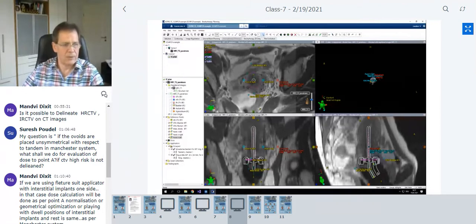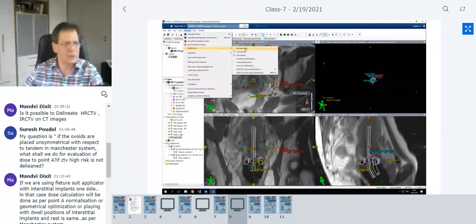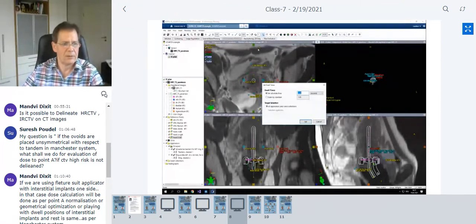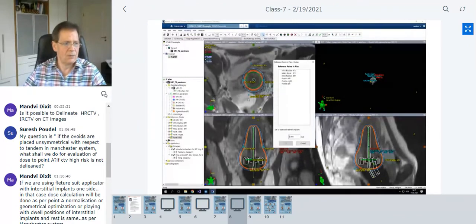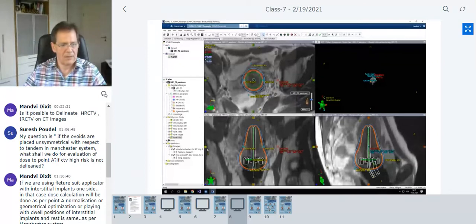We just need some dose. So we need some time in the 12 times or in the 12 positions. So there's one possibility, the simplest possibility: I set the 12 times manually. For example, I could start with a time of, I don't know, 15 seconds, always for a 10 Curie source. So the activity here in the planning system is always 10 Curie. So if I set this, we get a dose distribution, which is not normalized to point A yet, which can easily be done. So I can go normalize to a reference point and choose maybe my point A on the right side. So I get 7 gray exactly on this point.